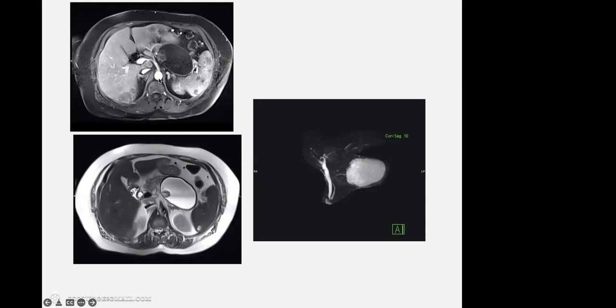So it is probably the late arterial or portovenous phase, because the portal vein and IVC also have contrast inside. Here sometimes we may get this type of patchy appearance, because the splenic pulp is very heterogeneous in taking contrast. So probably there are a few lesions in the spleen, but here we can only say there are few lesions in the spleen.